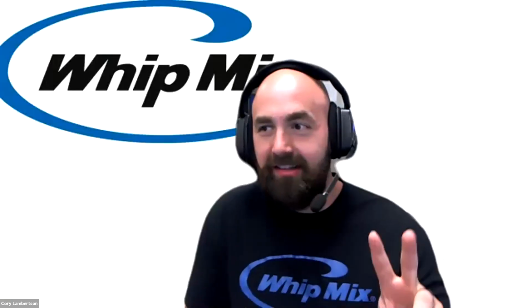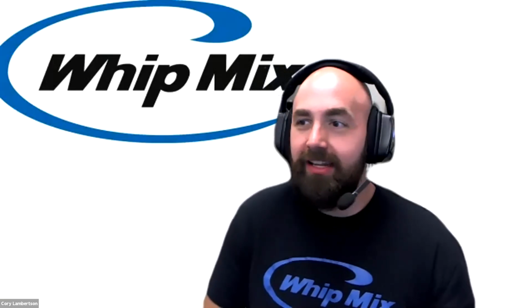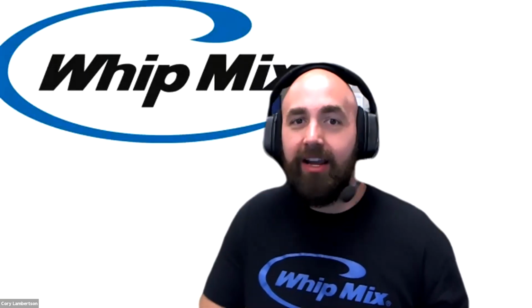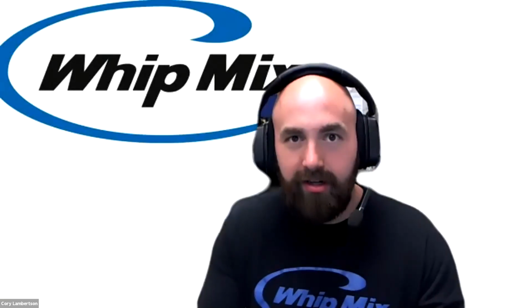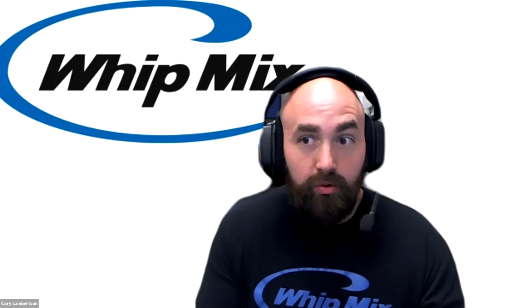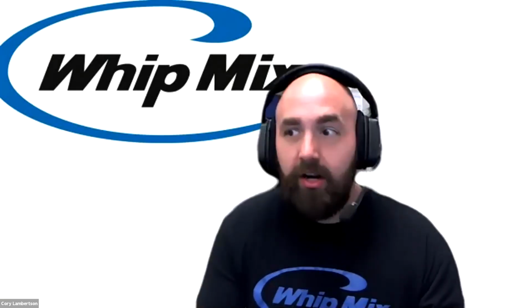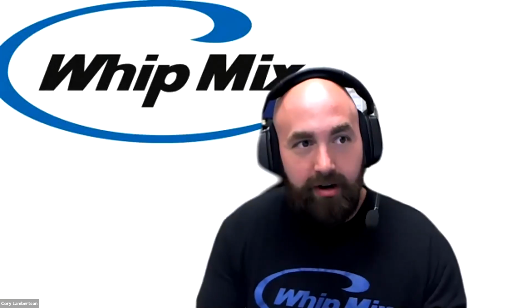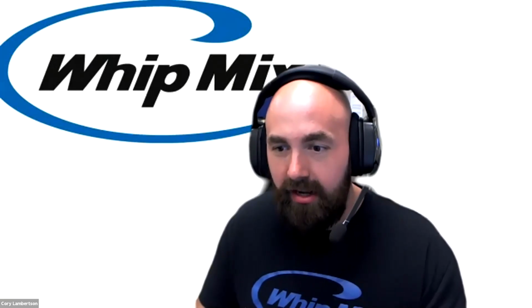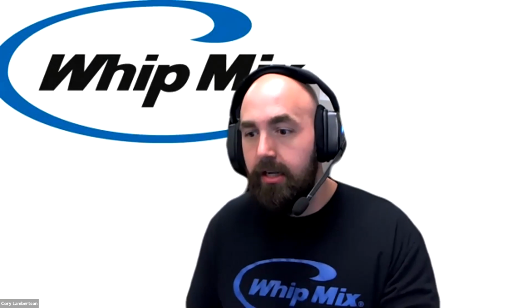For the second course for RPD's 101, today we are going to be covering how to design a flexible partial framework inside of the 3Shape dental system software for fabrication of a flexible RPD. Bryce is actually going to be covering the actual design process. I'm going to heckle them along the way. And if anybody has any questions, please feel free to ask them while we're going through it.